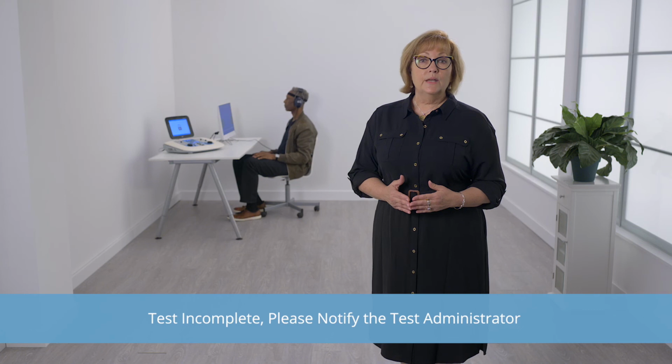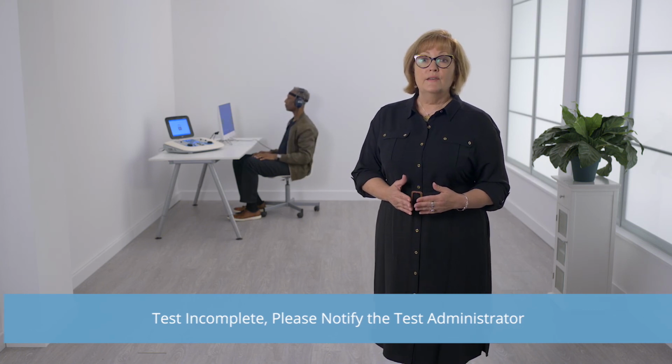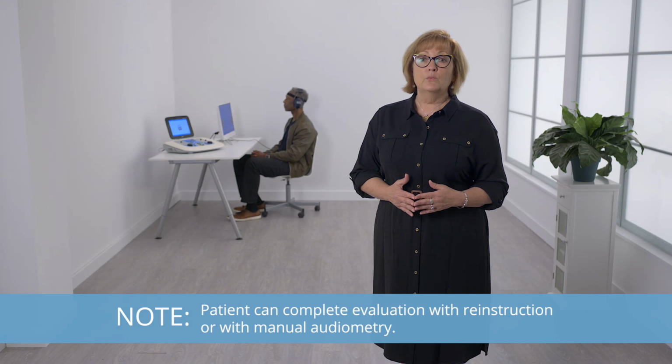If the patient does not respond to the prompts during AMTAS, the software will eventually display the message, "Test incomplete, please notify administrator." The results, if any are available, that are successfully obtained will be displayed in a professional report. The test facilitator or interpreting audiologist can determine whether the patient may be able to complete the evaluation with re-instruction or if the patient is a candidate for manual audiometry.